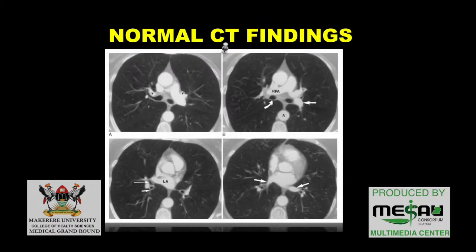And because our patient also had a CT, these are a few cuts which I could get for the CT, because we give it at different levels. So depending at what level the cut has been made, those are the structures that we'll be able to appreciate. So we have a little bit of orientation of at what level the cut is. For most of us who are not radiologists, you can always have the film. It has the markings of where the cut is being made.